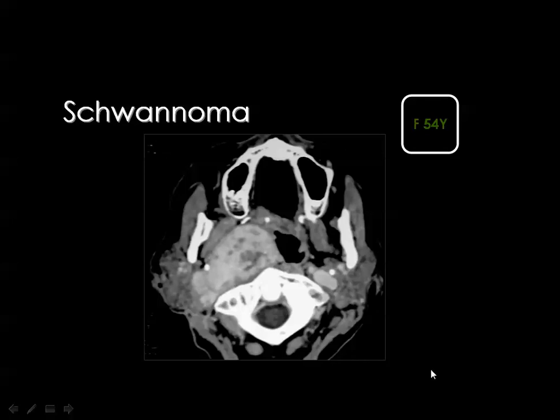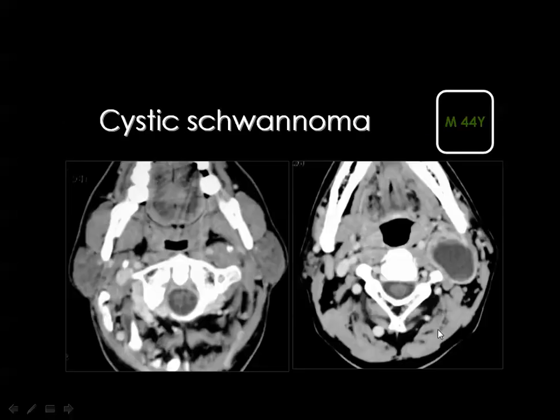One may ask about the displacement of the styloid process. Is it malleable so that it can be displaced easily? You know that a tumor of benign nature growing very slowly in this particular area, it will displace the styloid process gradually until it is pushed like this.